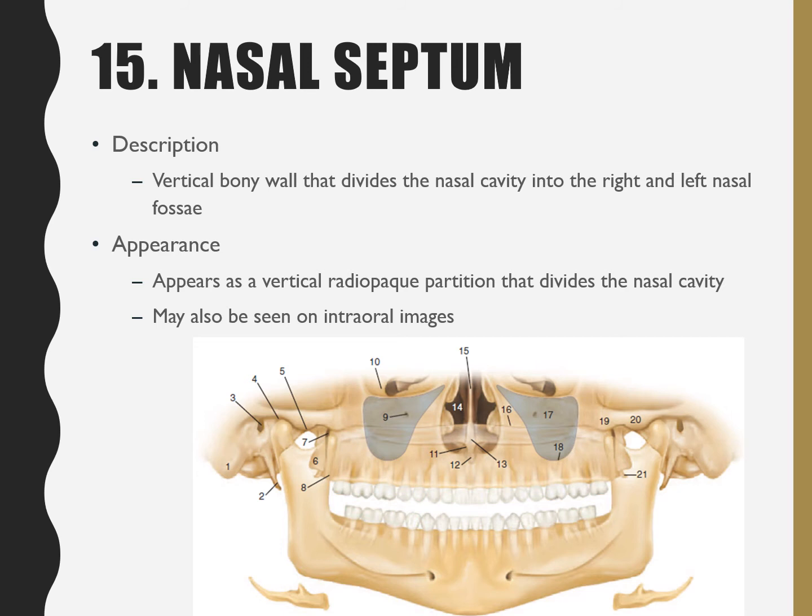Sometimes patients have a deviated septum, but sometimes too the panoramic, because it's not a perfect science, not everyone is perfectly fitted, and so sometimes patients aren't in the focal trough exactly where you want them, and the nasal cavity and all of that stuff is actually a little bit superior to where the focal trough really gives you good detail, and so sometimes there is a little bit of distortion on some of these structures, and that's okay.